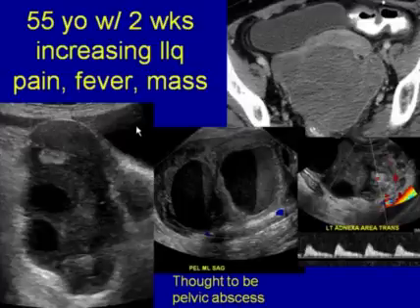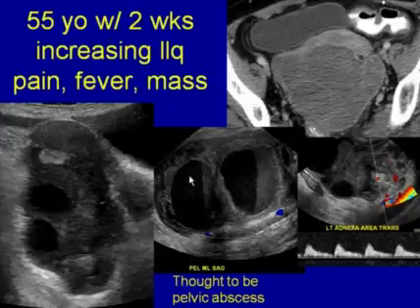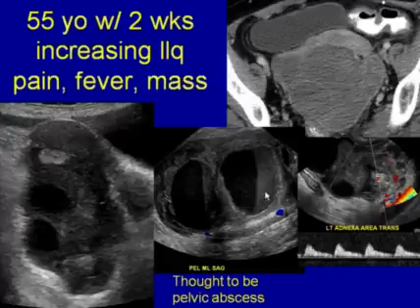Here is the bladder, transabdominal. Here's the uterus. Here is this mass with some fluid collections. You can see here on transvaginal, these are layering. You almost wonder, are these tubes or are these pelvic abscesses with fluid debris layers that happen to be located one on top of the other? We could find the right ovary, at least on ultrasound. The left one, it says left adnexa area, not sure where the ovary was.